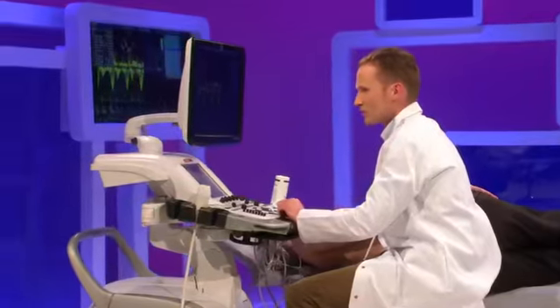So we report the S prime peak velocity, and we can also report the global longitudinal strain using the 2D approach or maybe also using the 3D approach, despite the fact that the value that we get in 3D is lower than the one we have in 2D. So we might prefer the 2D approach when we report for this patient the global longitudinal strain.